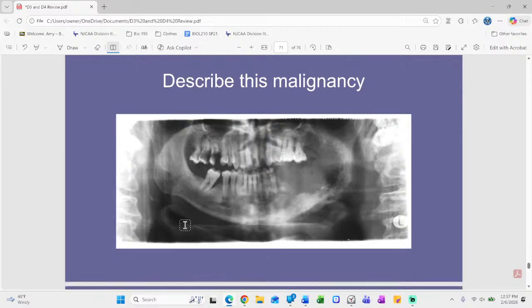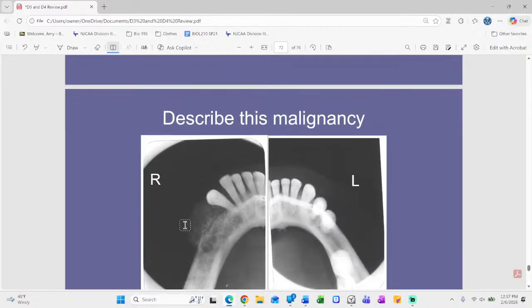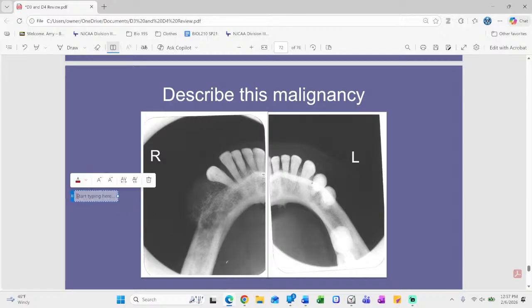Malignancy, right? Eating it up. Eating, taking away all the bone. It's that water on snow kind of look that just eats away at the edges. This is another malignancy that is pushing out. So that sun ray, those are some of those words, D3s for exam. Sun ray appearance here, that tumor in the bone here is pushing out. And periosteal reactions are some of those words you've learned.